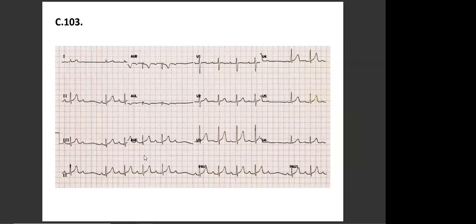I'm sorry, I have a question about 103. Yes. You said lead 1 was equiphasic, isn't it almost? Almost, and AVL, as you say, maybe it's a little negative. It's okay. It can be around 60, but I think it's a little more than 60, because if it was 60, leads 3 and 1 should be equal. Okay.